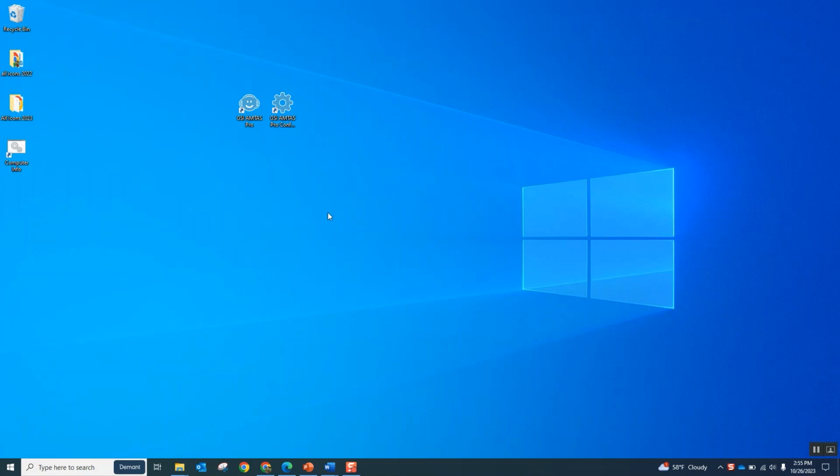When you install GSI AMTAS Pro, you will have two icons that appear. One of them will be the application itself. It has our picture of little AMTAS Sam right there. The other one is the AMTAS Pro configuration application, and it is a gear icon, which indicates that it's going to be full of settings that you can decide. So to open that, you just double click.